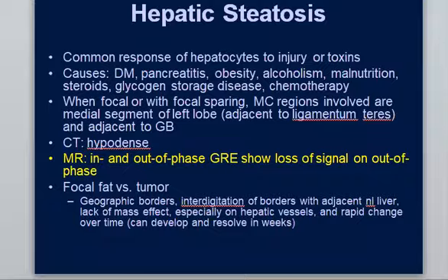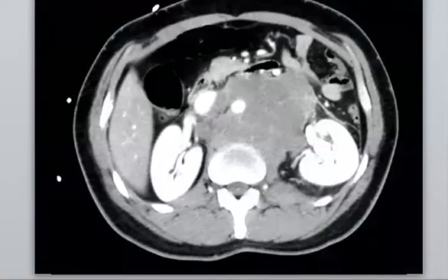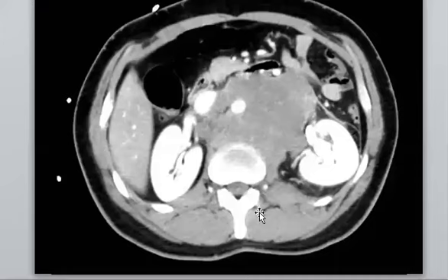Okay, so let's have another look at this case. Why lymphoma? Sure, you will mention the sandwich sign. Perfect, Marwa. Nermeen, Ala, mashallah, you get a high score, inshallah, in every exam. Elevated aorta, this is important to mention.